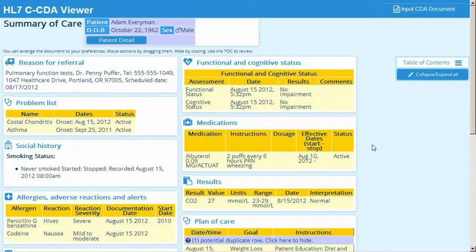I'll show some of these in a bit more detail, but wanted first to point out that as you make these changes to the ordering and to the visibility of a given section, those changes are recorded, or saved, and they're applied to any document that you subsequently open. So that is the case for the current document and for subsequent documents.